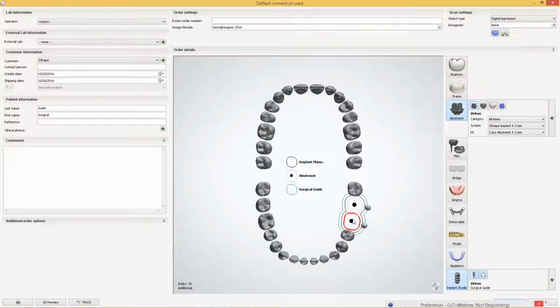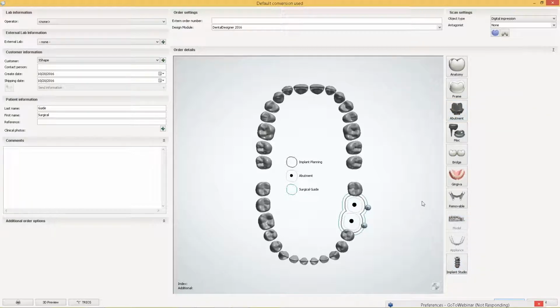To make things a little bit more interesting, a little bit different, I will select one of the healing abutments using one-piece library, and the other one will stay as a two-piece library. So I have a possibility of making those customized healing abutments either from prefabricated blanks with the fixtures already in them, or use a titanium interface with some sort of other shape or other material cemented on top of it. Doesn't matter if it's going to be metal, if it's going to be PEEK. I will leave it entirely up to you which material you would prefer to use in here.